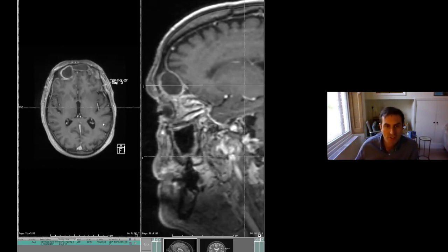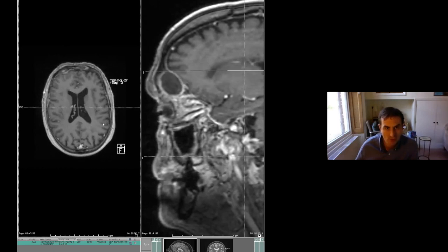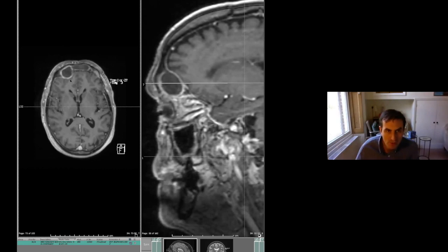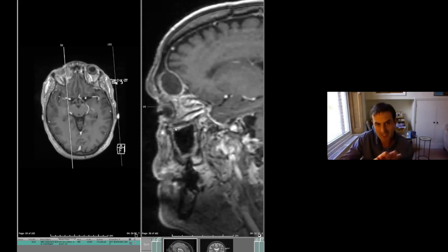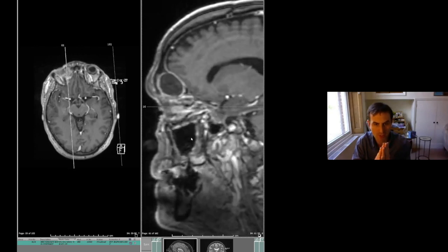Now, what I was interested in with this MRI scan was obviously to work out whether there's any involvement of the dura before proceeding to any surgery. But I think you may also be able to identify the presence of a fistula there. I think just below the line there, can't you? What looked to have happened in this case was that during the original operation there was no endoscopic approach. So the cells in the frontal recess hadn't been opened and there was no drainage into the nose.